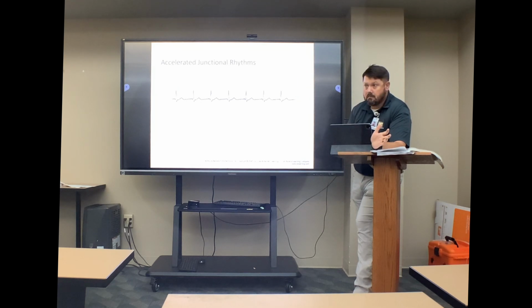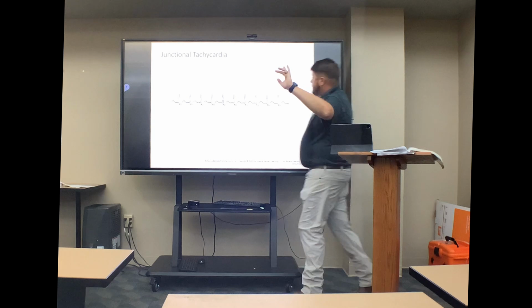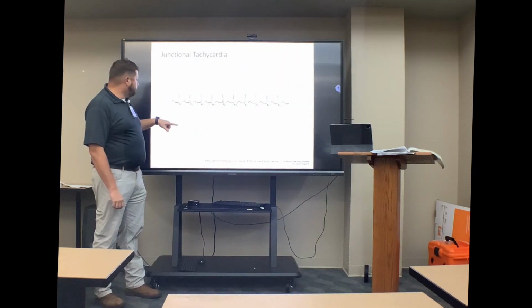Does that make sense? All right, so what about this one? 1, 2, 3, 4, 5, 6, 7, 8. I lost count. It's 100 or greater, right? Now, this P wave really, right?